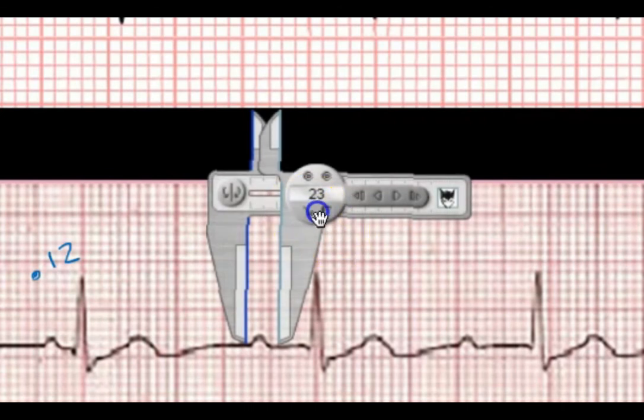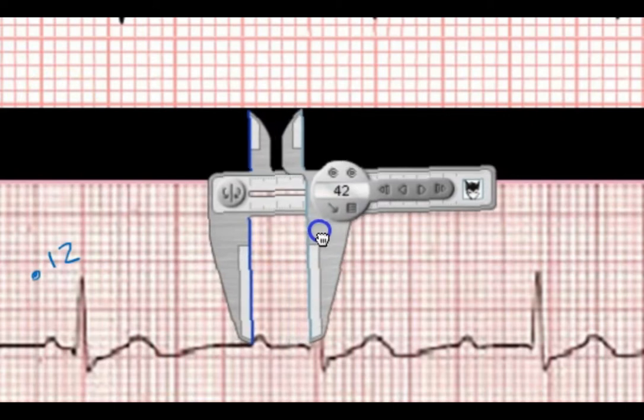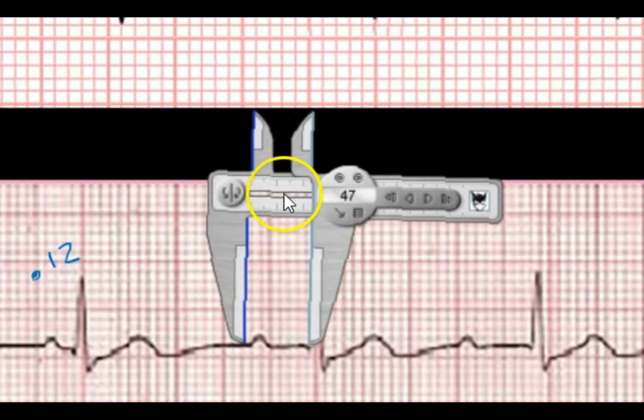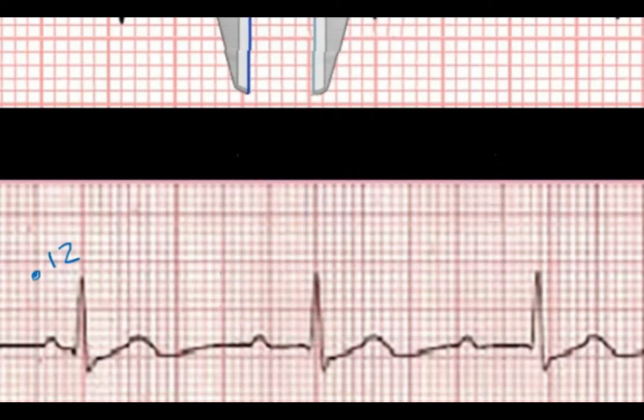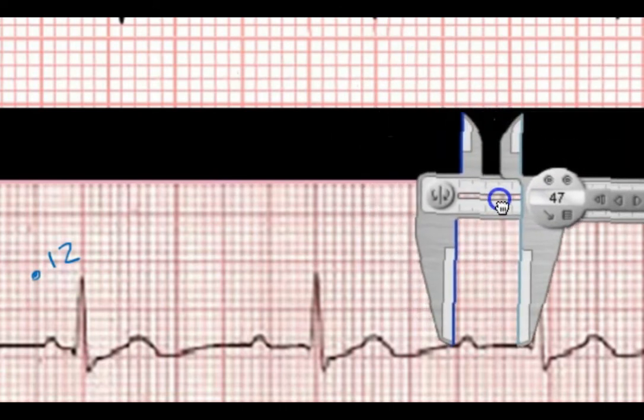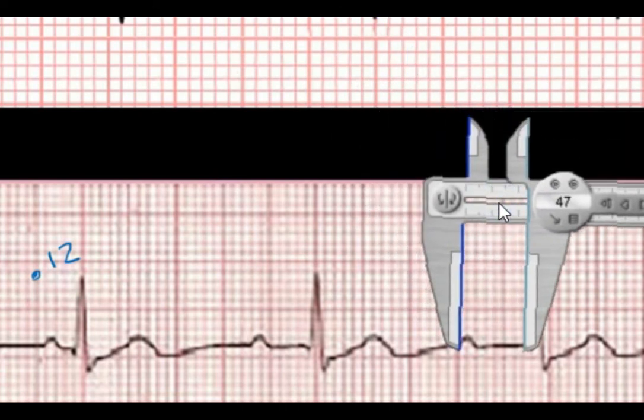This one, a little longer. This one looks like it went to 0.20. Okay, so we'll mark this one here.